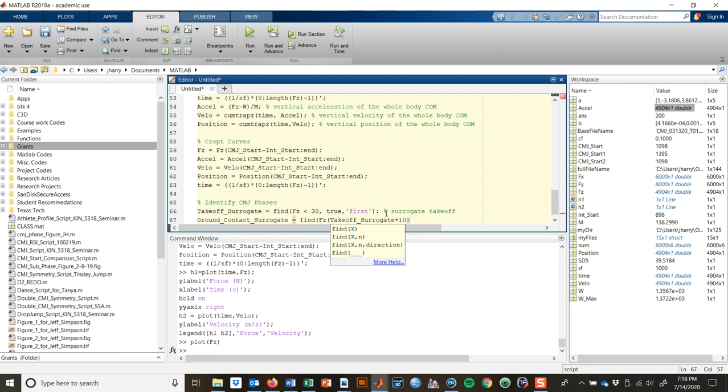This is not necessarily something you'll have to do if you're working in a laboratory with a very precise instrument bolted to the floor. But if you're working with a portable force platform, for instance, I work with the AccuPower from AMTI, and it just sits on foot pegs. Depending on your floor surface, you may not have a perfectly flush floor.